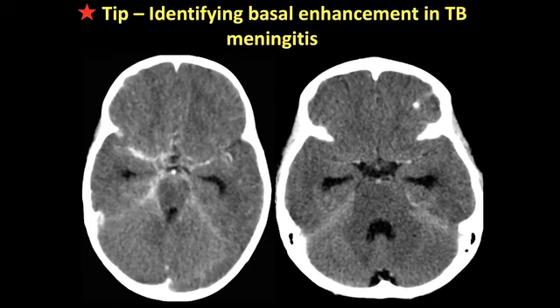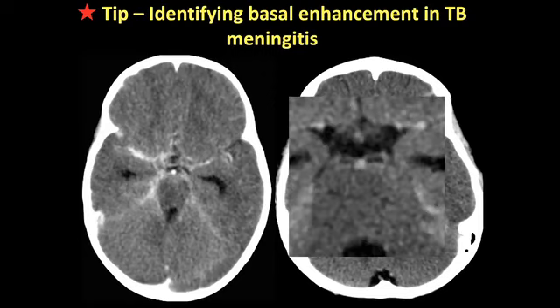When we looked at this, we were like, well, do we actually see basal meningeal enhancement? It can be very subtle. So you need to look for the things that are normal. Focus carefully on the basilar and the posterior cerebral arteries. And then a clue is to look along the anterior surface of the brainstem, and particularly the pons, because if you see enhancement there, there is no normal vessel that should be traveling there. And it's a marker of meningeal enhancement, basal meningeal enhancement of TB.